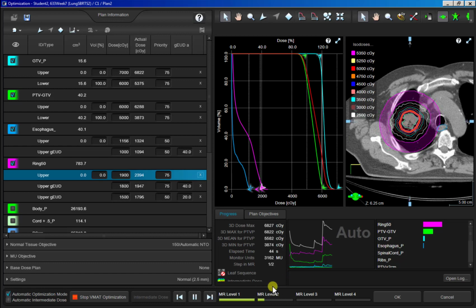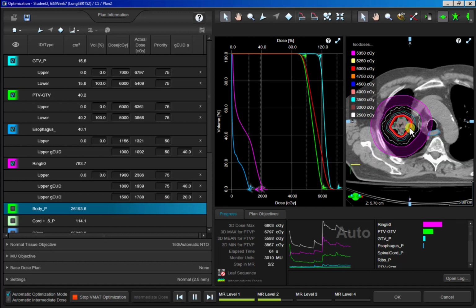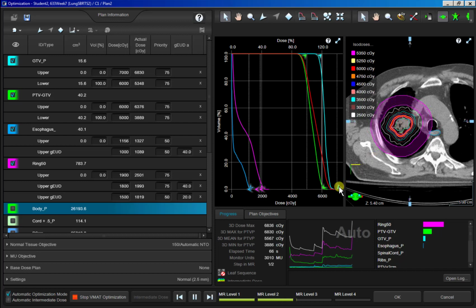If you notice in level 2, obviously we're not going to put a max dose on the body like we normally do because we're allowing a large hotspot, right? I'm not even going to worry about this coverage because we'll just normalize to whatever coverage we need. We're meeting all our constraints easy enough. Again, we don't care about that hotspot, so I can just normalize to get my coverage. I don't need to worry about that in the optimizer.